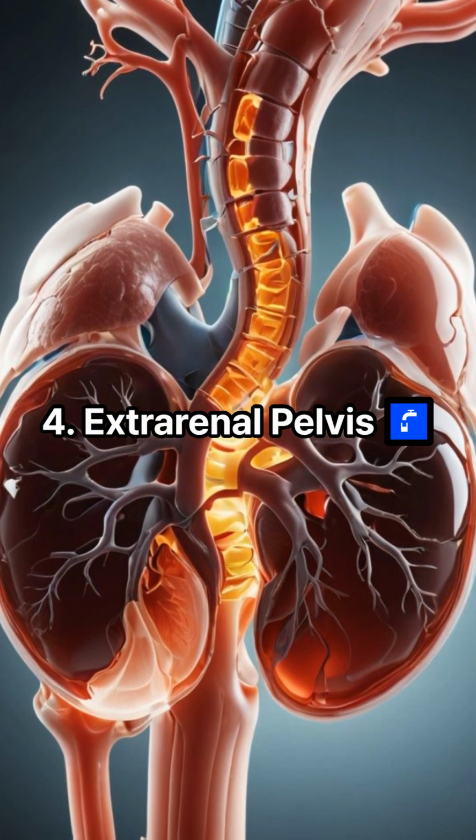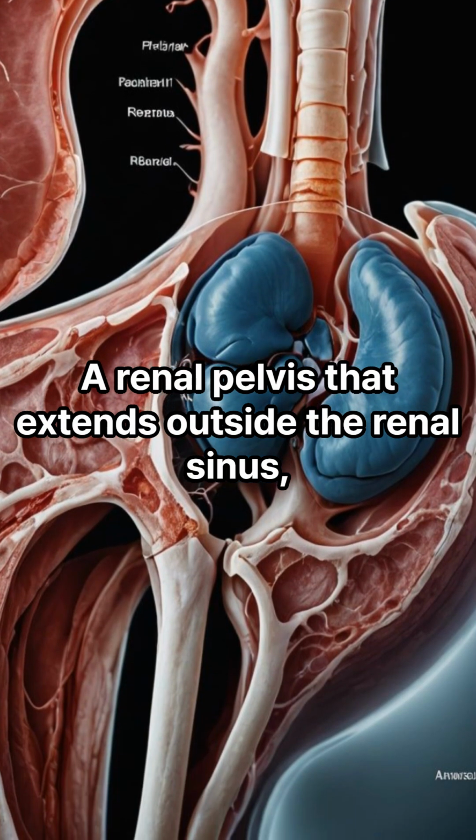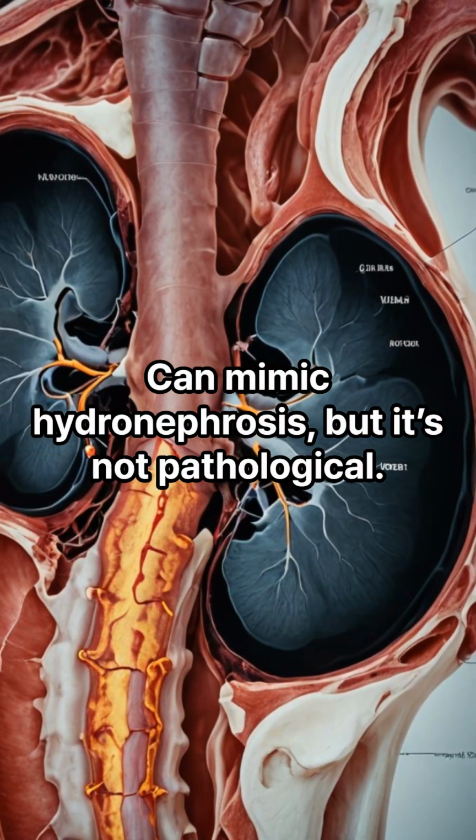4. Extrarenal pelvis. What is it? A renal pelvis that extends outside the renal sinus, making it appear larger. Can mimic hydronephrosis, but it's not pathological.